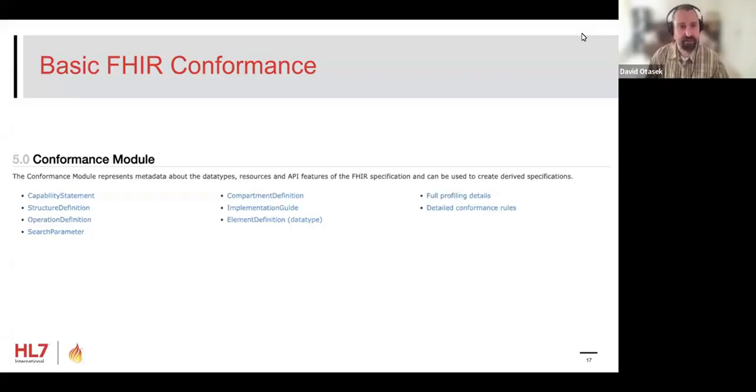One of the fastest ways to interact with it is through the Validator CLI, or command line interface. We'll look at that first, and then we'll explore some other tools that reuse the same open source code that it does. So let's take a look at a simple path of using the Validator command line tool.